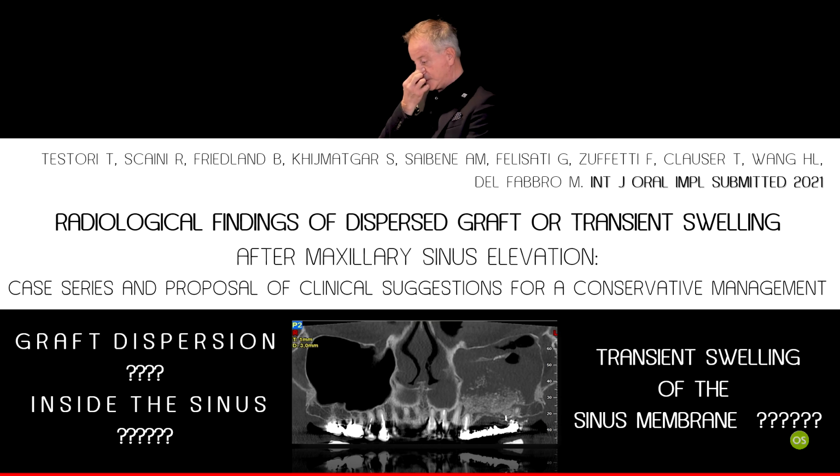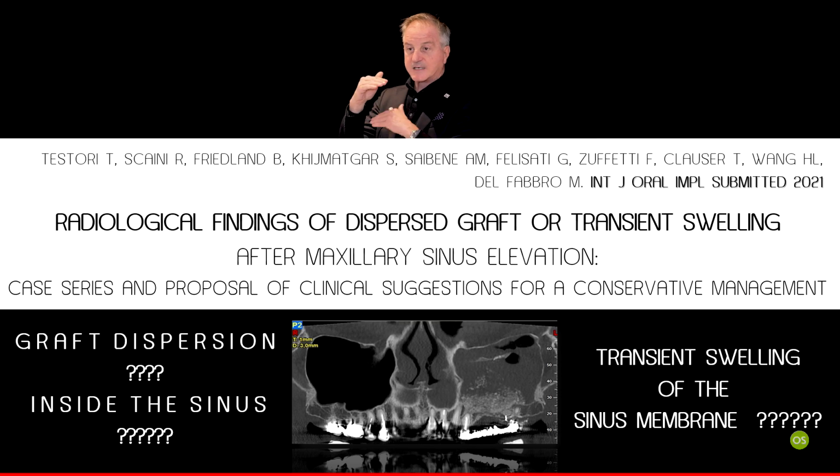this situation. Because if I'm showing you this situation, you might ask yourself, what is this? Is it graft in the sinus? Is it thickening of the membrane with the graft particles inside an inflamed tissue?